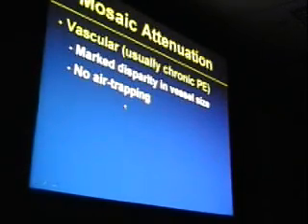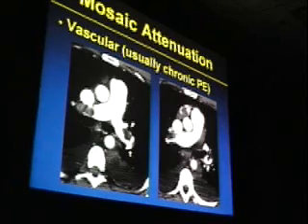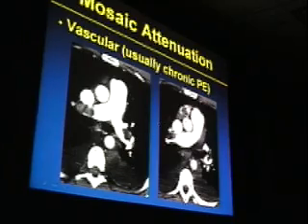The other feature, of course, if we had an expiratory study, we would see an absence of air trapping in that setting. Here is a contrast-enhanced scan through the hila demonstrating, of course, typical features of chronic PE, peripheral clots, clot in the right atrial appendage, etc.